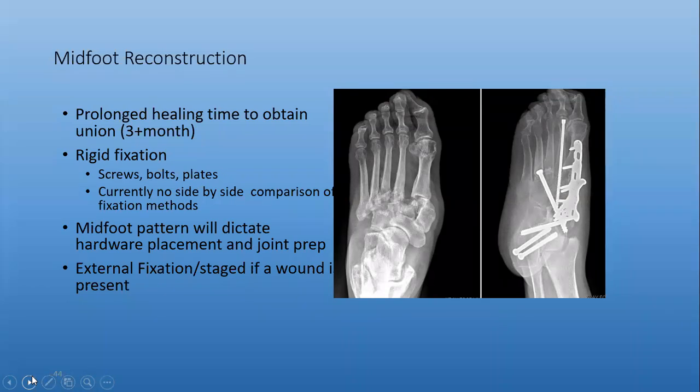I can take a whack at it. Okay, so you're looking at an AP view of the left foot. I see midfoot collapse. I see divergence at the Lisfranc joint. The medial cuneiform and the other cuneiform joints look like they're dissolving, and it just looks like the foot's widening. I don't see any edema or signs of gas or infection.